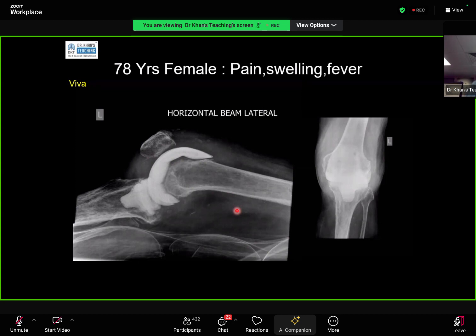Then I can see an interrupted periosteal reaction involving the medial portion of the femur with an ill-defined lytic lesion in the distal femur, corresponding to the anterior cortex of the femur. You're talking about this area where I'm pointing? Yes, sir. So this is also projectional. This is similar to this. This is quite a bit of osteopenia.